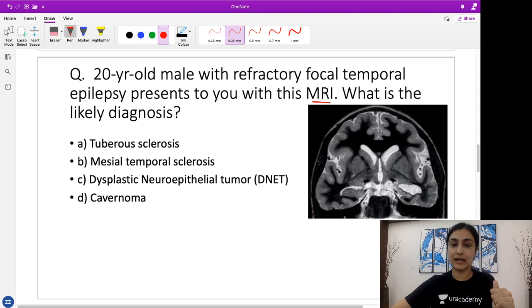So if we look at the calvarium right here, the skull bone right here, it's black, and the thin white outline that you're seeing is the subcutaneous fat. Now do not confuse the fat with the bone, guys. Remember, the thin outer rim is the subcutaneous fat, whereas the black thick calvarium is nothing but the cortical bone, and hence this is an image of MRI.